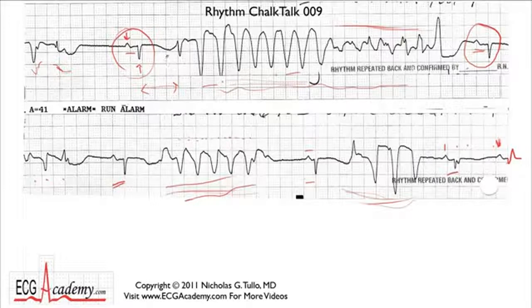So if we look at the T wave of this beat that precedes the tachycardia, I don't see any bumps or bites or anything high frequency that I would call a P wave. Remember, atrial activity on top of a T wave is usually easy to see, but I just don't see it here. So if there's no P wave in front of this beat, then the presumption is that it's ventricular. But if it's ventricular and you have rates in the 150 to 200 range, we're talking about ventricular tachycardia.